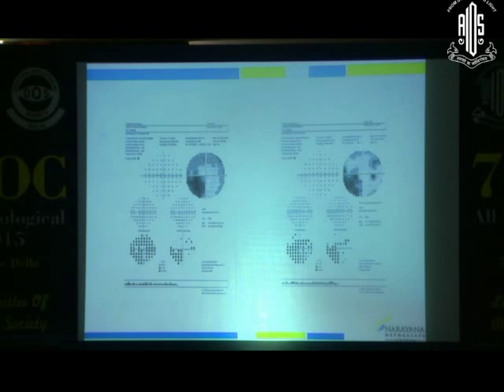So what is it? Pie in the floor. So when you have a pie in the floor, where is the lesion that you're suspecting? Yes, so it's on the right. Because it's a left field defect, the disease will be on the right side, so it's a right parietal lesion, right? So when you get a field like this, you have to look and see the same thing. Usually in neurological cases, if they are young patients, you really don't get that much of a generalized depression, so you can in fact look at the gray scale, and if there is a lot of confusion, then you need to go to the pattern deviation.